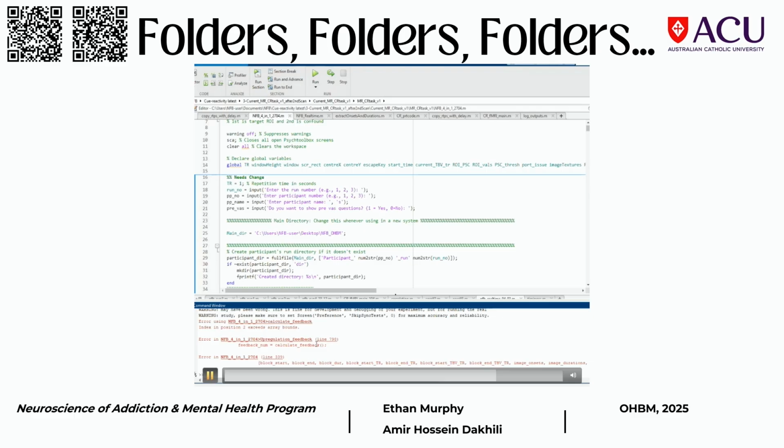Yeah, so the wrong folder. So you have to set your target and your feedback folder to the correct location.